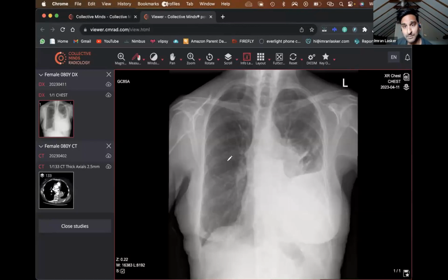So we can see here that this patient is an older patient in terms of they are not a young adolescent, because when you actually look at the bones over here, you can't see anything in the way of any growth plates.